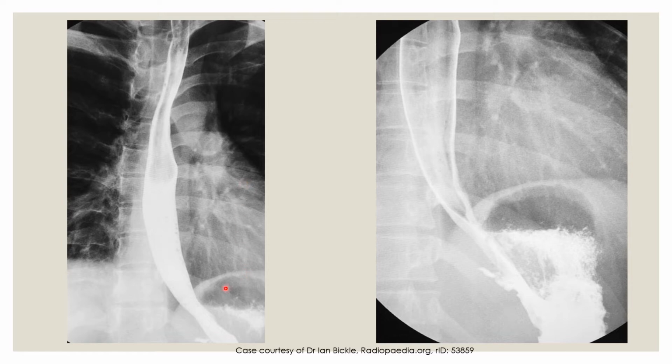Again, we have the heart border and the heart, which is slightly higher in density, and you can see it's more grey. And finally, we have the normal thoracic esophagus, which is very, very high in density, as we have swallowed high density metallic liquid.